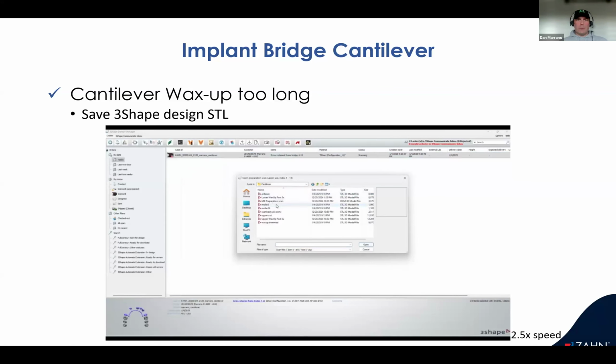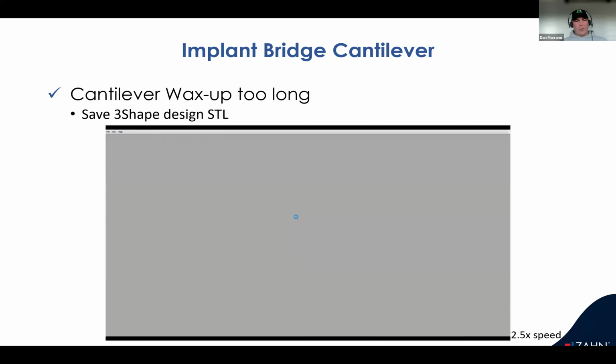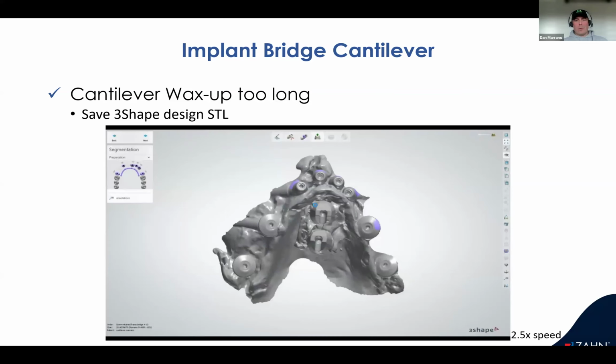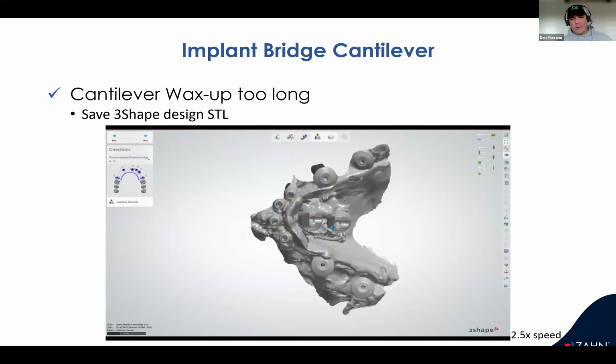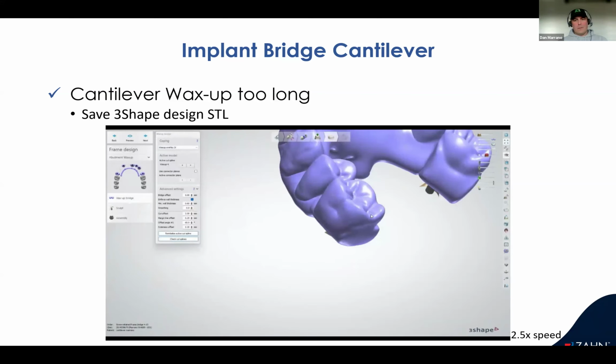This has been really useful, especially with converting dentures that they don't want to change, or a design that I don't have anymore, or say you're trying to reopen a design and you lost your design, whatever the reason. Everyone here can think of a number of reasons why. So now there we are.